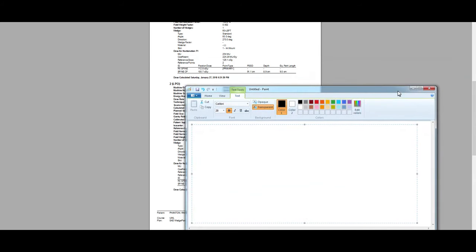So if I look at field 1, spine CP is getting 100.7. So let's pull some of this information in here.